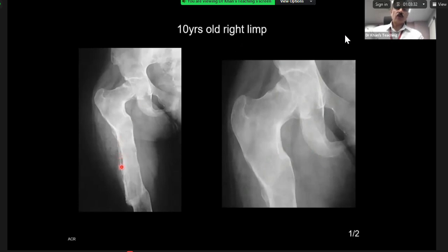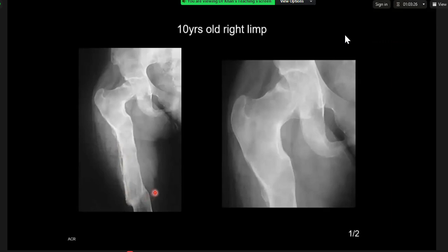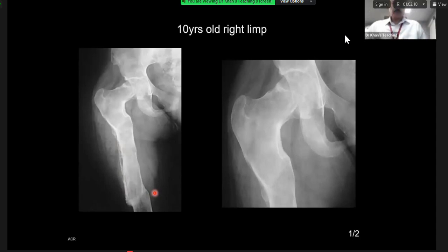What is this? I think that's new bone formation, essentially. So the lower down, it looks like there's probably been a pathological fracture, which is sort of amalgamated with a... Is it healed? It's healed, yeah. Right. Okay, I'll take over.